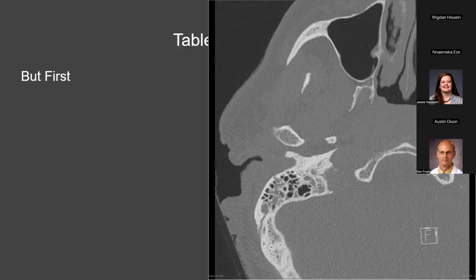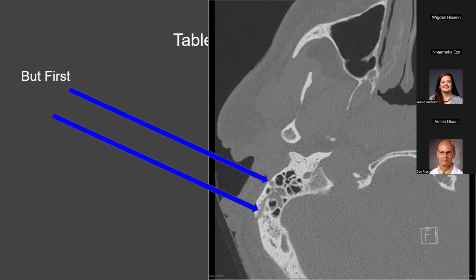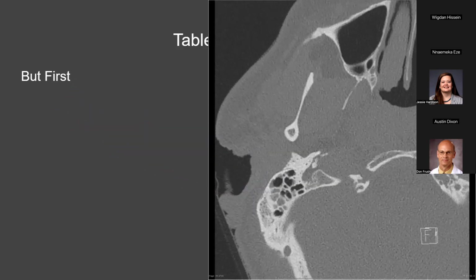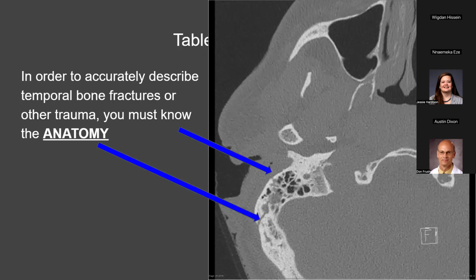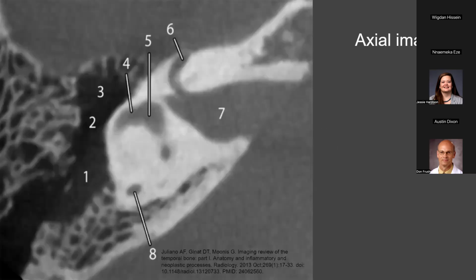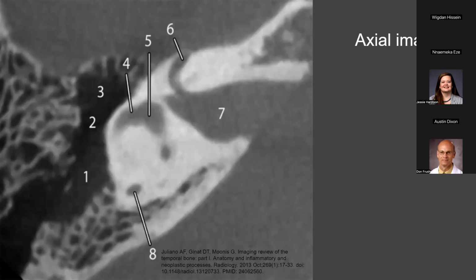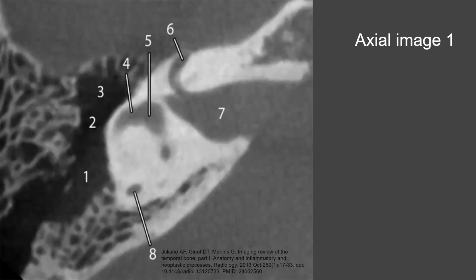And we'll, by the end of this lecture, hopefully be able to describe what exactly is going on here and what's involved. All right, so let's get into that. I have some numbered things here, and we're going to go through them, and I'll give you some ways of thinking about this that make it easier for me.